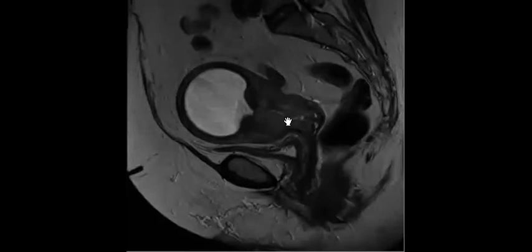Yes, there is distension of the uterus, and it looks like hydrometra, whatever the content. You need the other sequences to prove that it is fluid. But okay, if you consider it as fluid, it will be hydrometra. You can see that the bladder is empty, and you need more images to check for any infiltration of the surrounding, but consider that there is no infiltration.